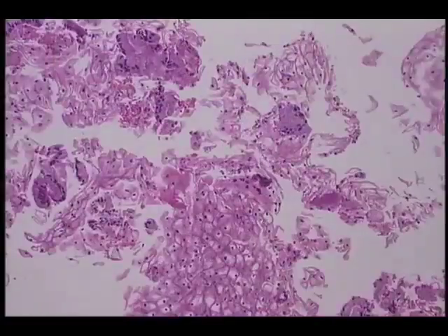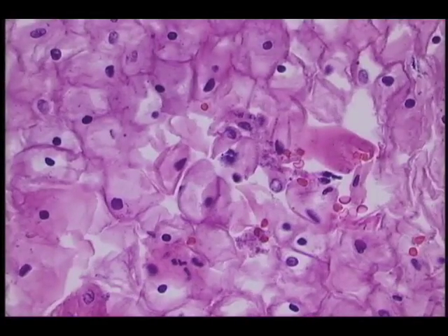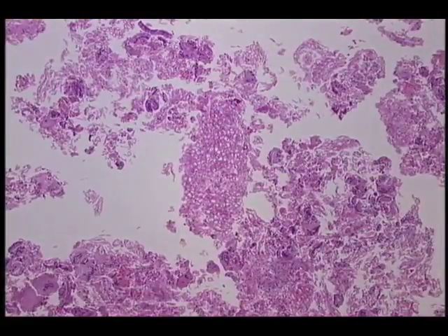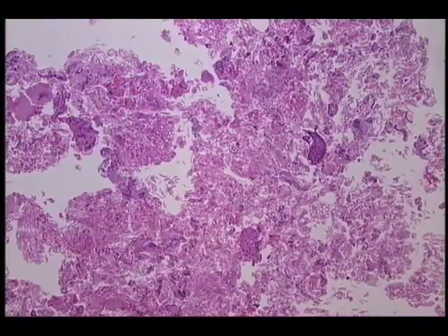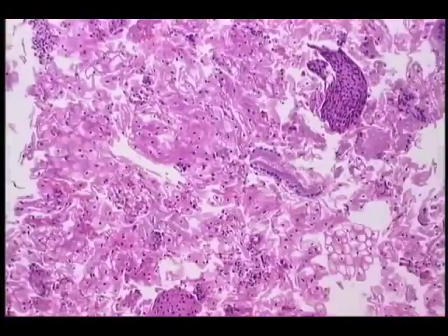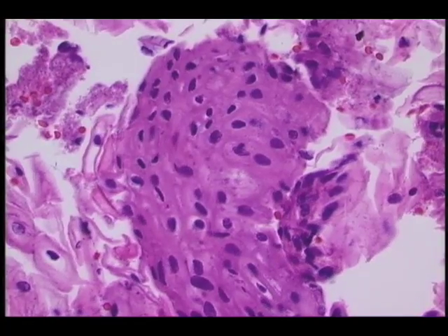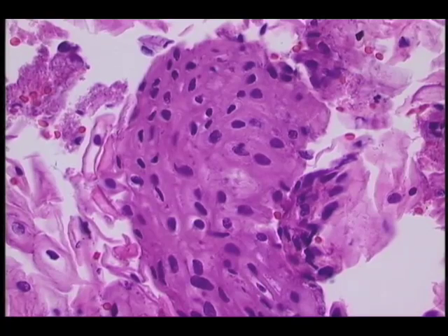The nuclei are small, centrally located, and even upon very careful scrutiny, the nuclear membranes are smooth. The chromatin is evenly distributed, and it reassures us that these are completely normal cells. The endocervical sample fragments are also benign, and of course we have pieces of squamous metaplastic epithelium, which again can have some intercellular variability, but have the characteristic flow of squamous metaplasia.